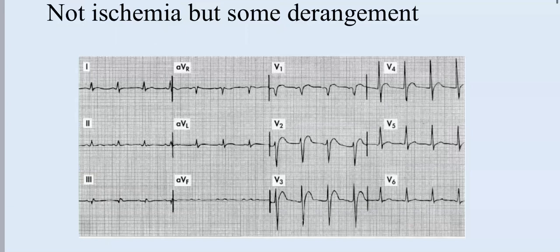There is ST segment elevation, but that's not ischemia, it's something else. Anybody? Hypercalcemia. Thank you so much. This is hypercalcemia. Can you tell me why? Short QT. Very good. We have short QT, and more precisely, we have a short ST.